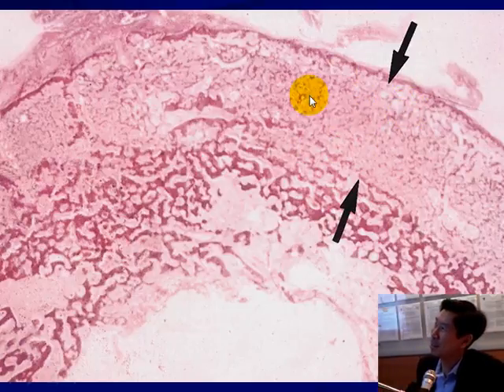So this is these bony areas. It's called the pumice bone. It lacks the strong interconnections, and so this is, even though it's very thickened cortex, it's actually very weak cortex.